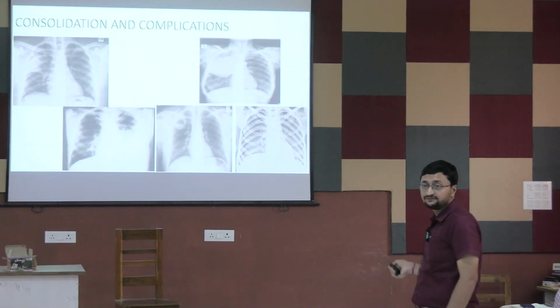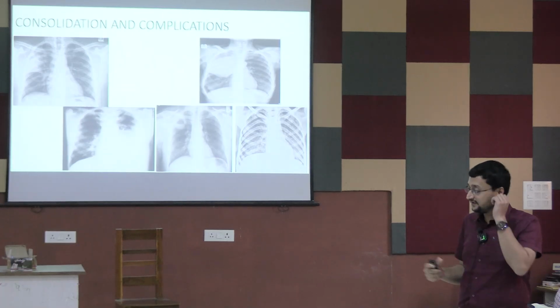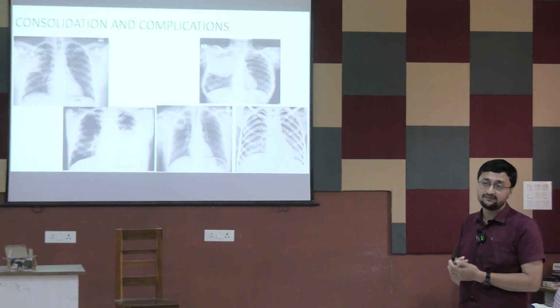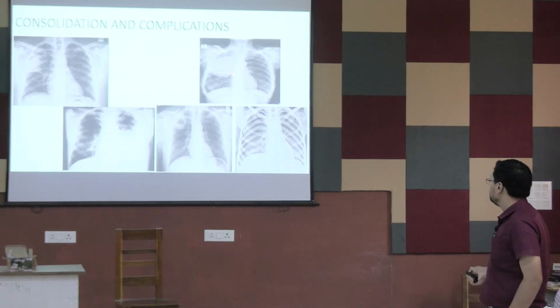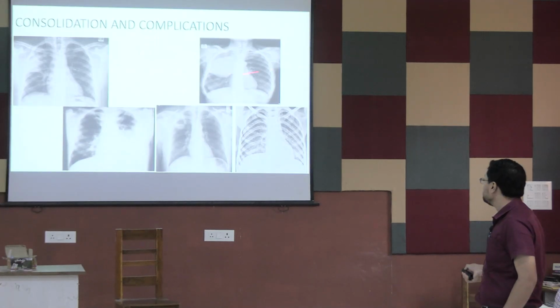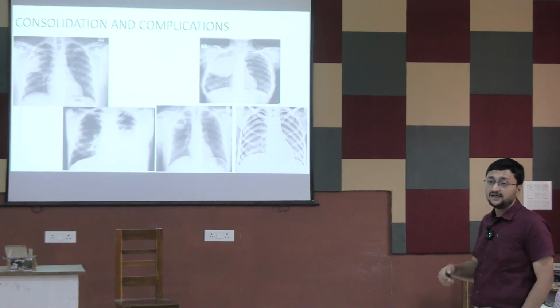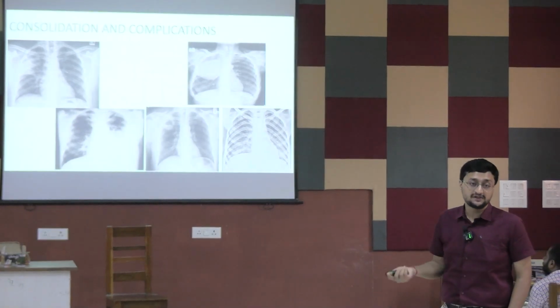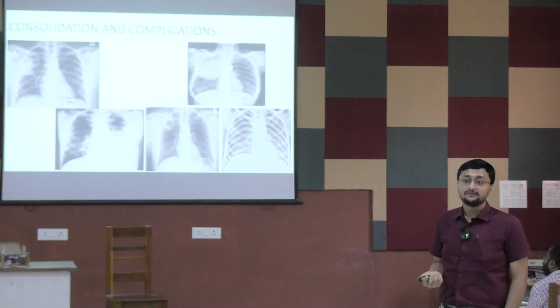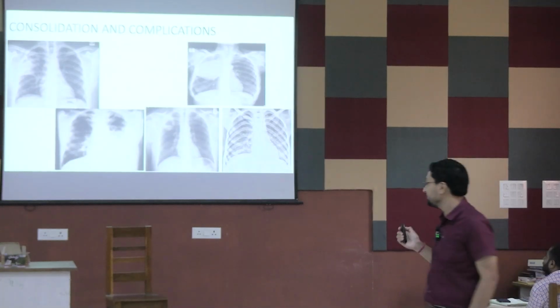And this, I gave this MCQ on pneumonia last time in class, in the previous year. What is this? This is the bulging fissure sign. The horizontal fissure is bulged downward, and there is an inhomogeneous opacity at the right upper and middle zone. In which pneumonia does a bulging fissure occur? Very good, Klebsiella pneumonia. So this is a case of Klebsiella pneumonia.